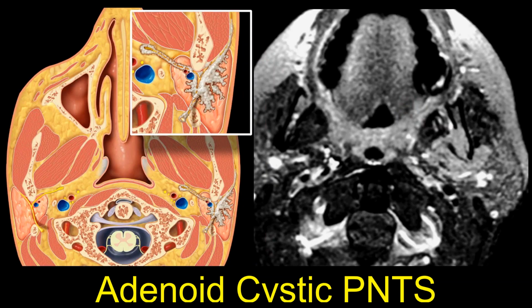Now, again, we'll talk about cranial nerves more in later lectures, but there are some areas where they come together. We're often talking about cranial nerve 5 and cranial nerve 7 when we talk about perineural tumor spread. And there's an area where 5 and 7 come together on the auriculotemporal nerve that connects 5 and 7 below the foramen ovale and in front of the stylomastoid foramen. And this is just a nice example of a perineural tumor that was crawling along that auriculotemporal nerve connecting 5 and 7 on this post-contrast MR. So anytime we think about cranial nerves, we want to think about imaging from the origin nucleus all the way out through the end organ.